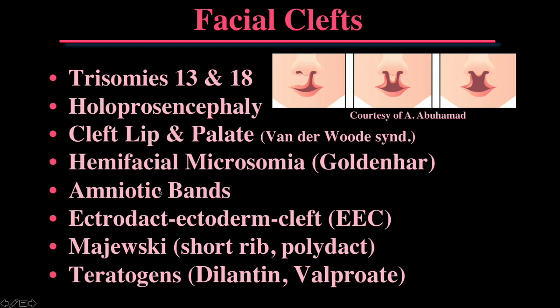Amniotic bands can disrupt the entire face. If you have a band that traverses through the face, you can have disruptions of all different types that really don't lend themselves to any description by embryology, because they are basically destructive bands rather than lack of a normal embryologic development.